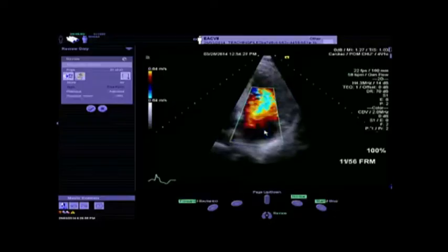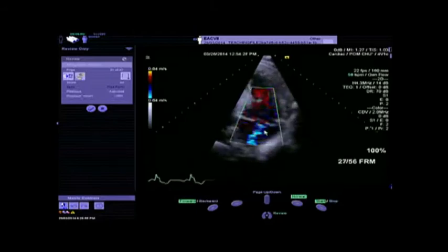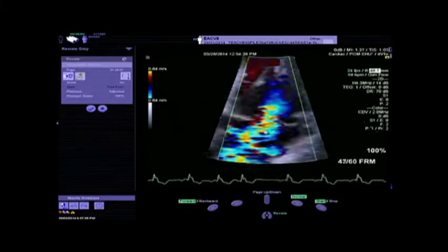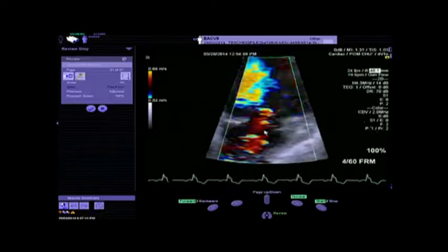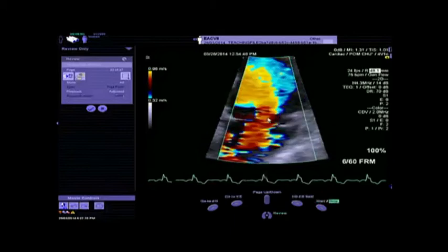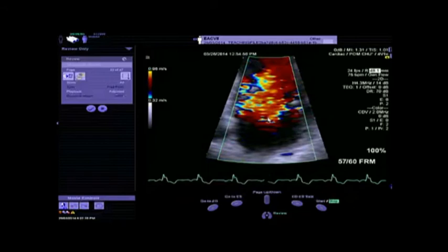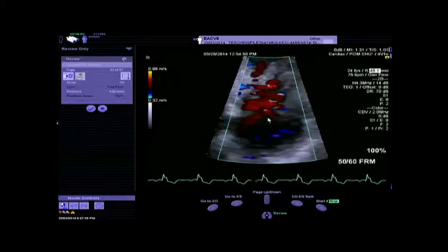We should use more quantitative parameters, and the apical 4-chamber view is the recommended approach to use the PISA method. And what are the steps to analyze the PISA method? First, the apical 4-chamber view, switch on the color Doppler, optimize the gain, zoom the selected image, and after that you will decrease the zero baseline progressively to obtain a hemispheric PISA. You will freeze the image, go through the cineloop, and try to get the best frame with the largest diameter to be measured for the quantification of the mitral regurgitation.